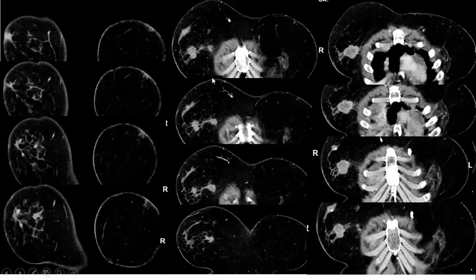And here, if you look for the peripectoral edema, and if you come here, look for the lesions, it is almost abutting the pectoralis. And look here, the edema is enhancing, and the pectoralis itself is focally thickened and enhancing. Look for the extension into the pectoralis, which signifies the pectoralis itself is being involved. Okay, the pectoralis is involved.